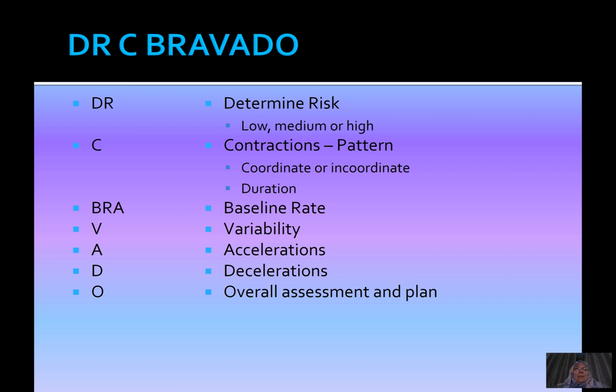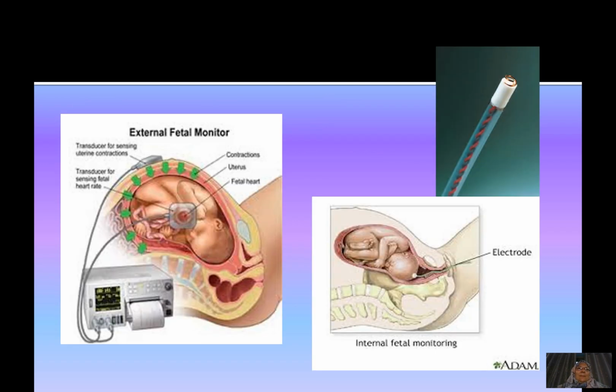Please have a pen and paper with you for this lecture, so you can make notes as we look at CTGs. You can look at them yourself and see what you find, and then compare it to my interpretation.